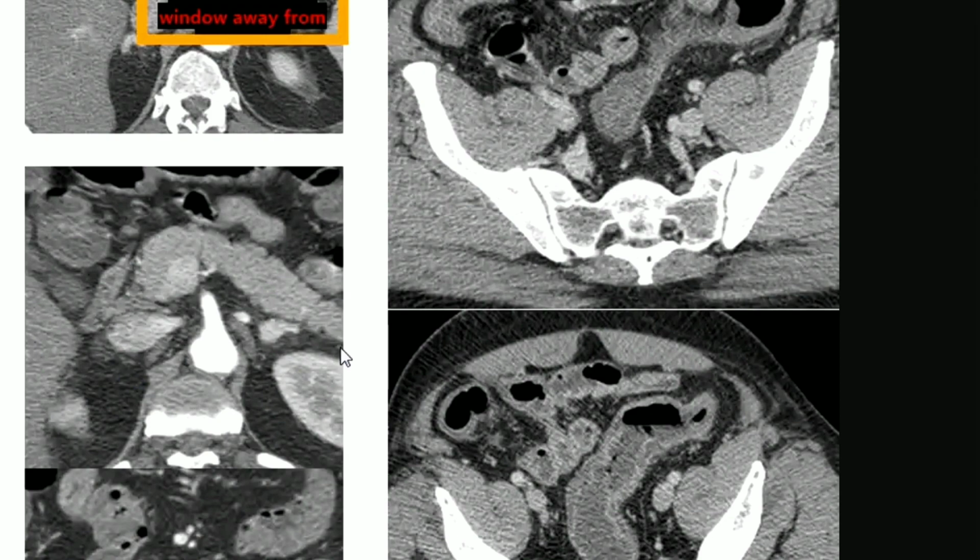Any question? There's a question: can it be Takayasu's disease, an inflammatory disease of the vessels? You mean distribution of the vessels? Is the celiac artery fine? Yes, it is patent. Vessels are patent, celiac and superior mesenteric. Only mild calcified and non-calcified atheromatous plaques, especially at the celiac artery, and the aorta as well.